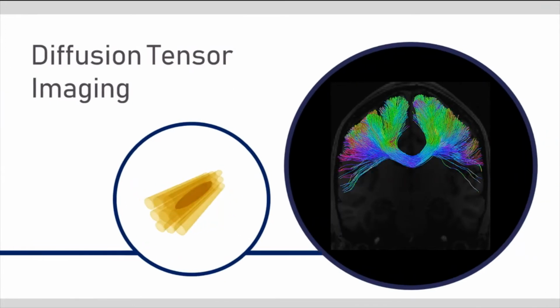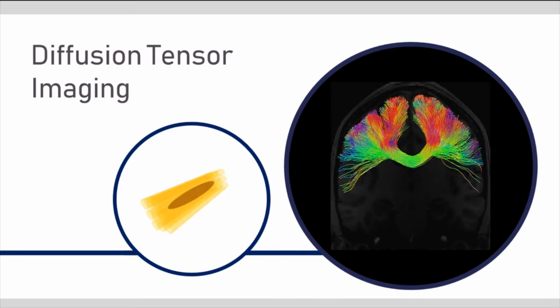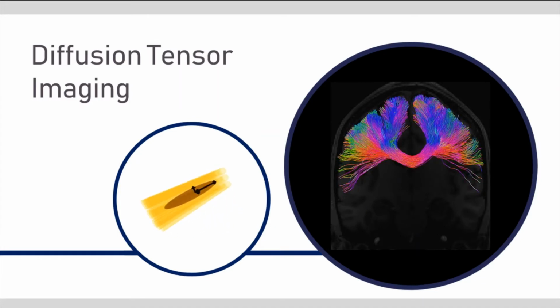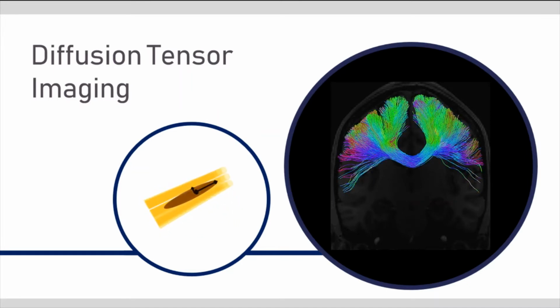Due to its highly organized fibers, analysis with diffusion tensor imaging, or DTI, has provided new relevant information about the corpus callosum. DTI is a type of magnetic resonance exam that collects information about how the water moves inside tissues. In the brain, this gives us information about how the fibers and paths are organized and is especially rich for corpus callosum analysis.